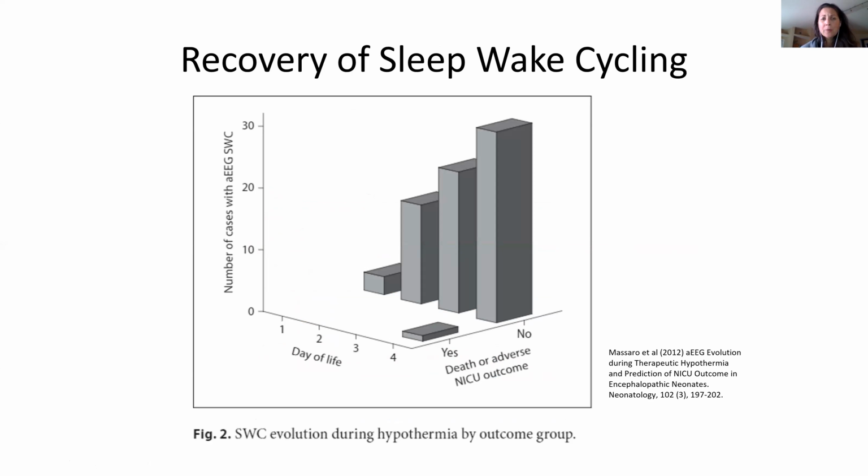And Massaro's group, again from DC Children's, found the same thing: on day of life 4, those babies who had the best outcomes had recovered their sleep-wake patterns by that 4th day. So by that rewarming day, by the time you've completed that.